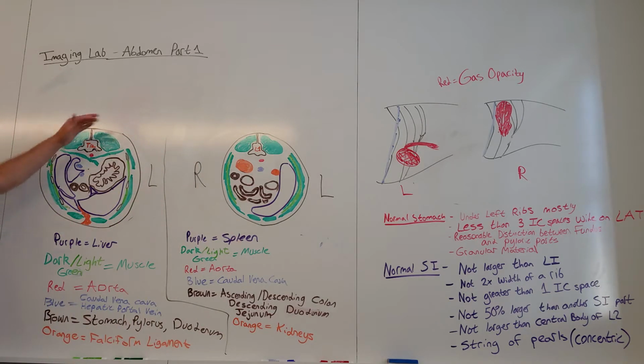So I think that exhausts the majority of this one. Again, the pylorus should be more to the left than the duodenum, and you can easily recognize the duodenum. So the pylorus, or the pyloric part of the stomach, or the pyloric valve, should be somewhere around here.